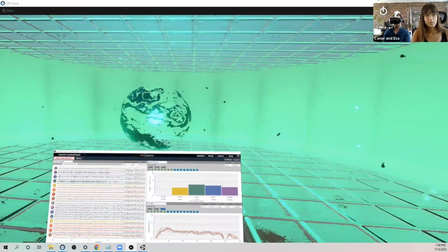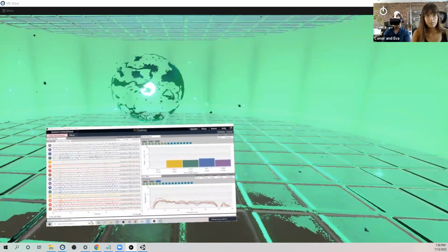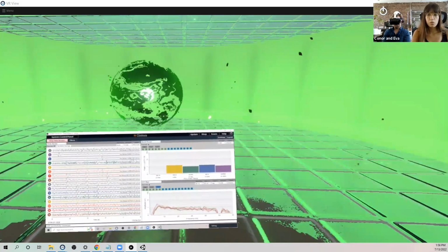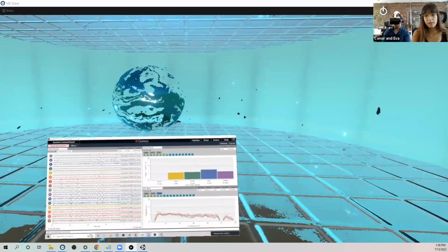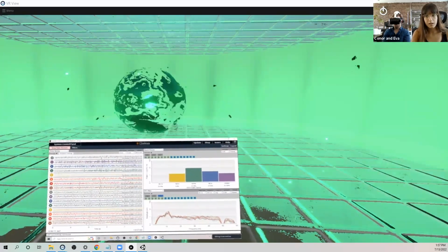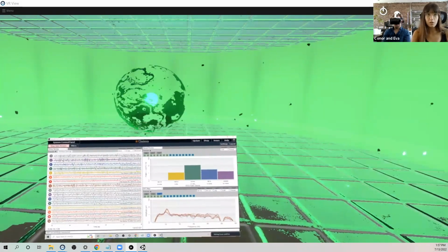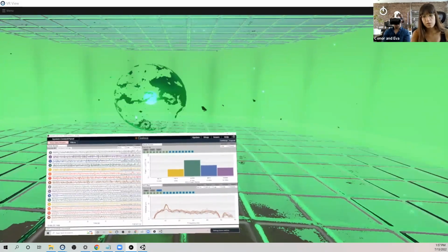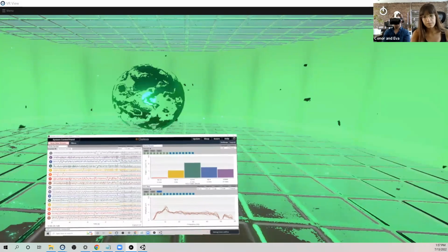Now open. So now it's turning a little more bluish. And I'll close them again. Blue is mapped to beta, which is more like when you're concentrating or active. So when he opens his eyes, it tends to go to blue a little bit. And now his eyes are closed, so it's back to strong green. And you can also see the peak in the FFT on the GUI.